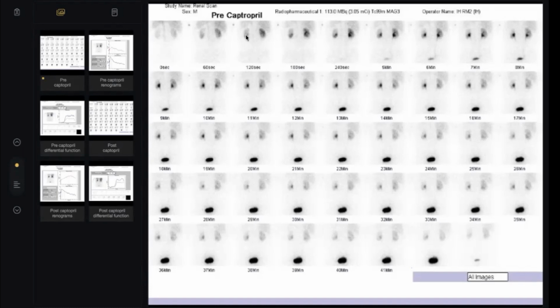Here, less tracer uptake than here, and even here, and here. Look at the kidney as a whole. This is the pelvis, by the way. Look at the kidney as a whole. Okay? It is obvious here is less than here. Then the excretion of the urinary bladder starts from here. No problem. The most important, I will show you one image.